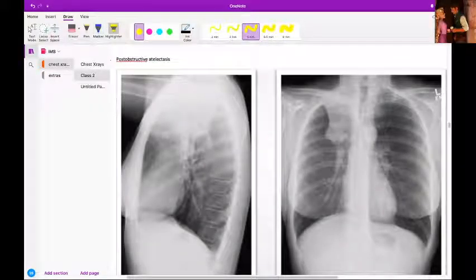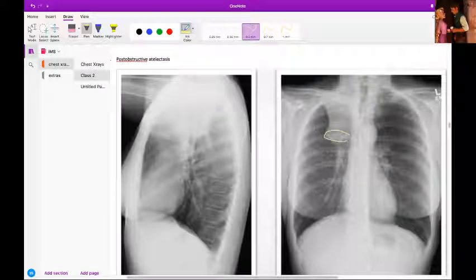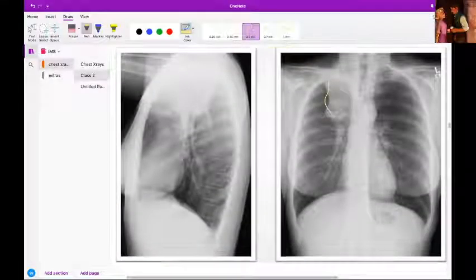Okay, so basically, what causes these obstructions? It can be a tumor, it can be a mucus plug, it can be a foreign body. Any of those things will cause an obstruction, and then suppose this is the alveoli and this is the bronchi. It causes an obstruction. Now, whatever air is remaining, it'll get resorbed and it'll cause an atelectasis. So then this alveoli will shrink. This is called post-obstructive atelectasis. Over here, there is an atelectasis of the right upper lobe. Okay. All right.